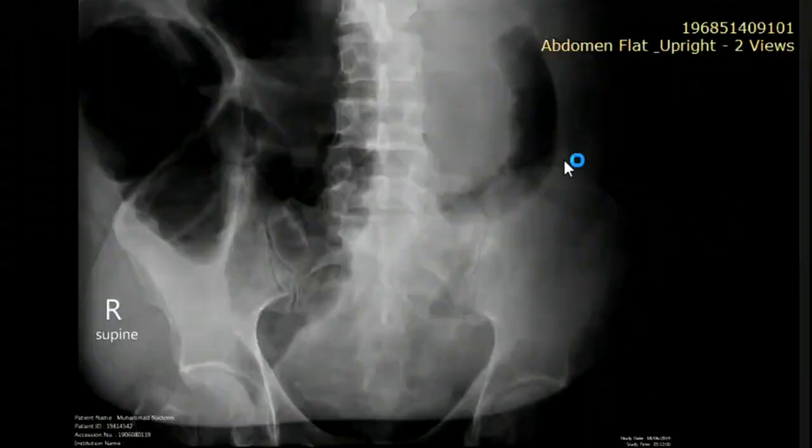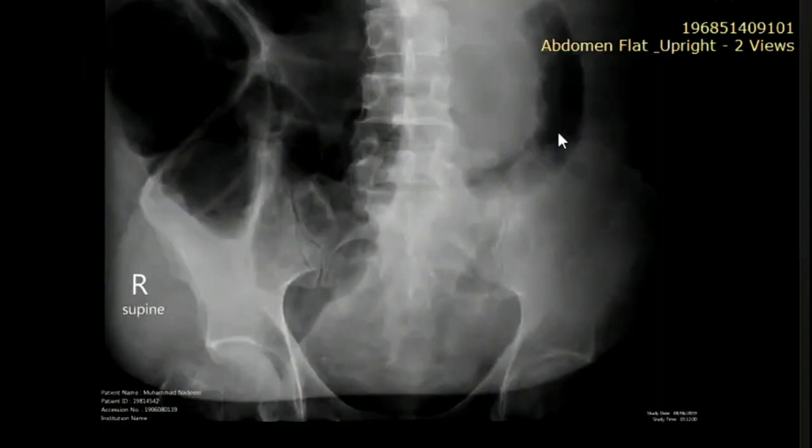This is an X-ray abdomen of a skeletally mature patient, which shows a large distended bowel loop is noted with haustrations seen, and I can also appreciate that there is upstream small bowel dilatation as well. However, I cannot appreciate any evidence of pneumoperitoneum. There is no evidence of calcific density focus seen.